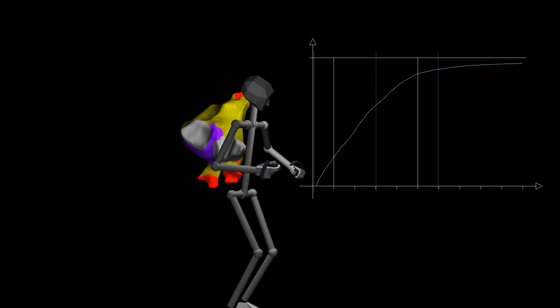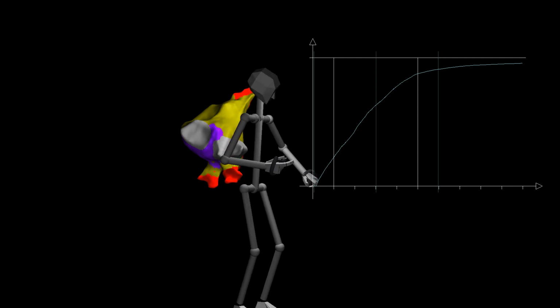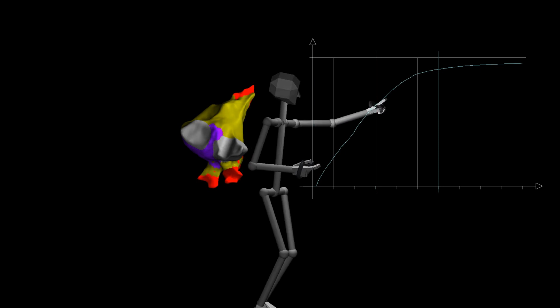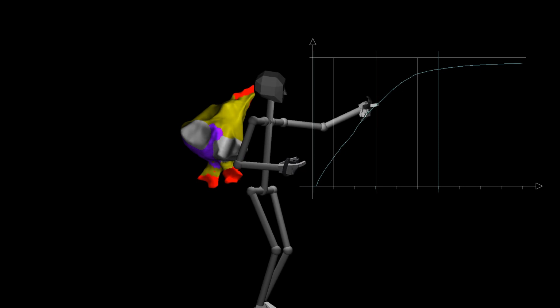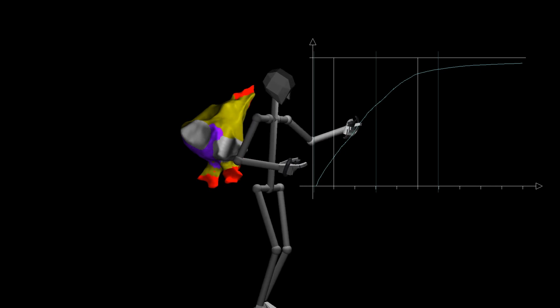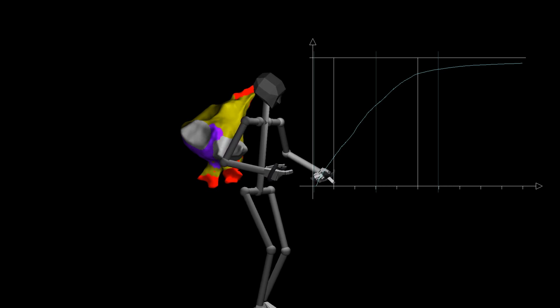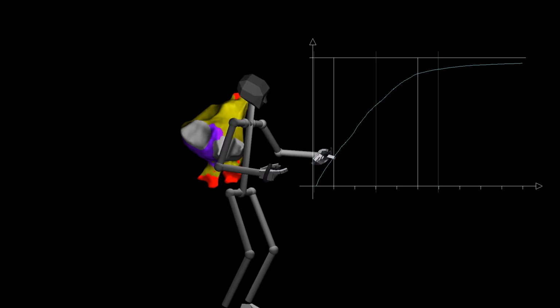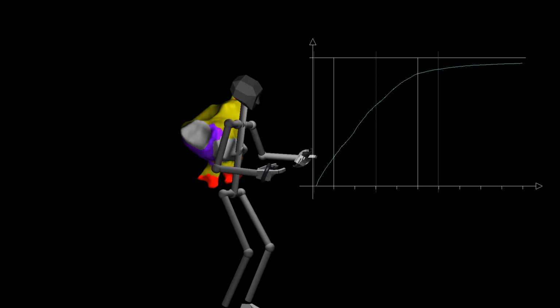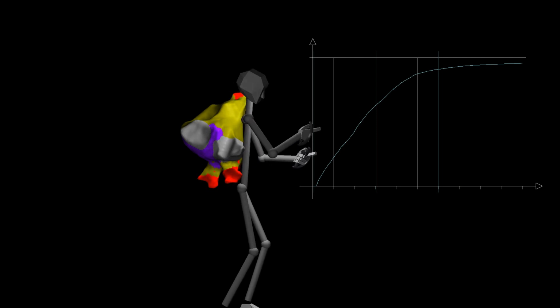What this graph means is, this is essentially the analog to a cumulative probability distribution function, which means that the vertical position of this line indicates how much of the heart surface has voltages below the horizontal component. So in other words, this would be 0.1 millivolt. If we track this 0.1 millivolt line up until it intersects the surface, then if you put this to the left, this much of the surface is below 0.1 millivolt and this much of the surface is above 0.1 millivolt.